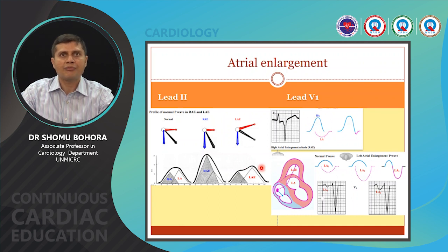So if you have a right atrial enlargement, the RA part will get taller and the terminal part will get lesser, and therefore you get a peaked P wave in lead V1 in right atrial enlargement. While in left atrial enlargement, the LA part gets more, and therefore the terminal part being more is suggestive of a wider as well as a deeper terminal negative complex in V1, which suggests left atrial enlargement.